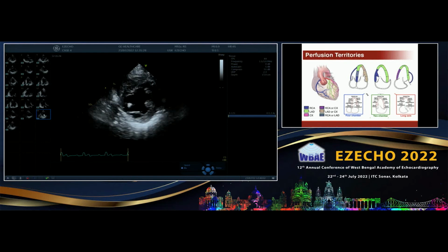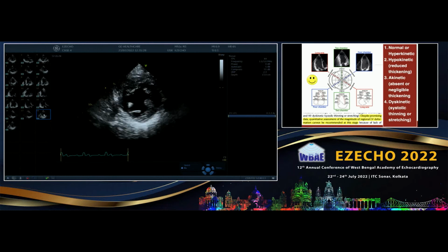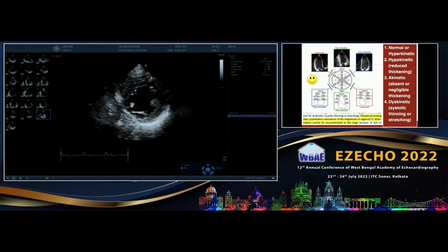And 17th segment is your apical cap. Okay, so that cap does not have any lumen in it. So that you would see only when you are using a contrast or on the MRI. So generally 16 segments is sufficient for the non-enhanced echocardiography. Okay. Any questions?